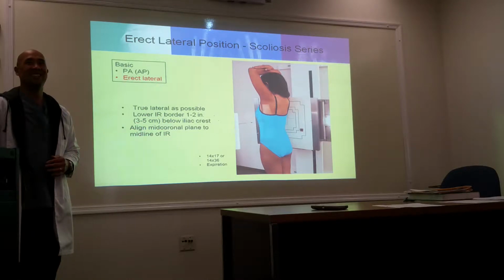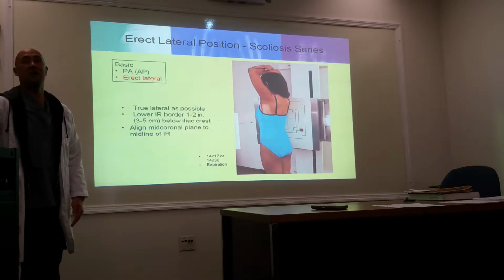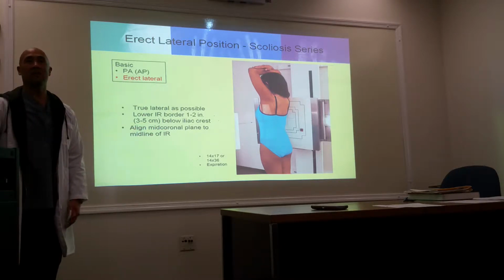I hate when I get guys like you. Is it 16 by 16 or 14? Yeah, it was the same digital receptor. They still miss you with the 16 by 16, so they missed the bottom part of it. Oh, yeah, the costophrenic angles were kind of sticking to the side. How about the sides of the lungs? Did they clip off the side of the lungs? It started to clip the sides off like 2/3 of the way down.